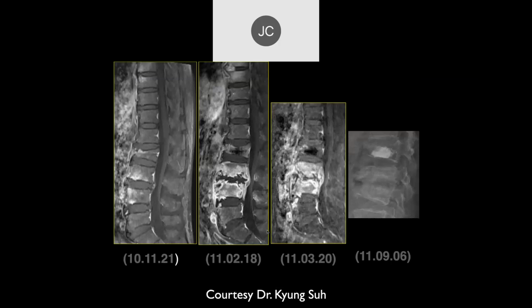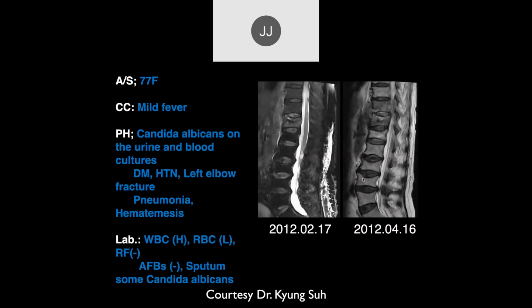And here we can see this again. So again, the dates: this is probably 2010, November 21st, I would think. So this is 2011, February 18th, 2011, March 20th, 2011, September 6th, and we can see the progression of disease, and this turned out to be a fungal disease. Wow. Never heard of it. I certainly have heard of Candida. That's common.